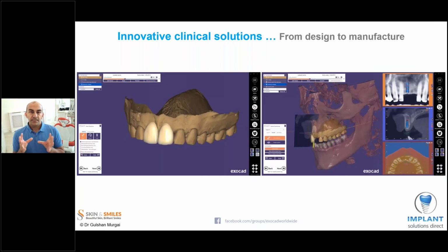Now, Exoplan is a software package that allows you to restoratively plan implant placement. And what that means is that for a long time, many people have been placing implants, and there have been lots of different trends. I wouldn't say it's a current trend. I think it's going to be a long-term trend that, given that people don't want screws, they want teeth, it's important that we can look at an end goal and engineer backwards from there. And that's what this platform is all about.